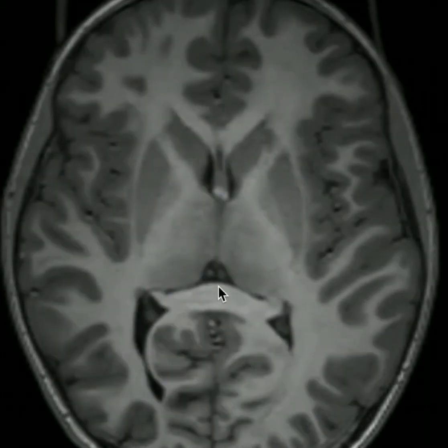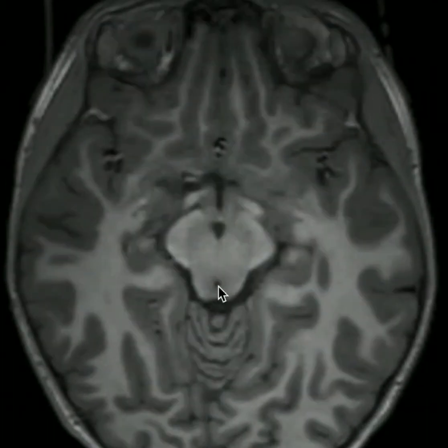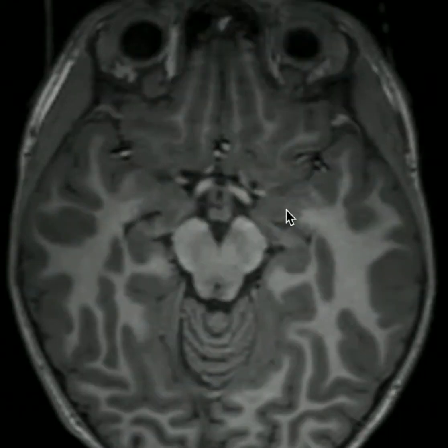Scrolling back inferiorly now, I'd like to point out the uncinate gyrus. The uncinate gyrus forges a connection between the amygdala and the hippocampal head right here. This is our uncinate gyrus. The uncus consists of the uncinate gyrus plus also portions of the anterior parahippocampal gyrus and the hippocampal formation. Together, these structures can herniate medially and inferiorly against the tentorium.